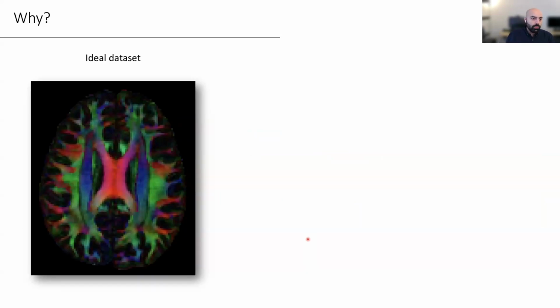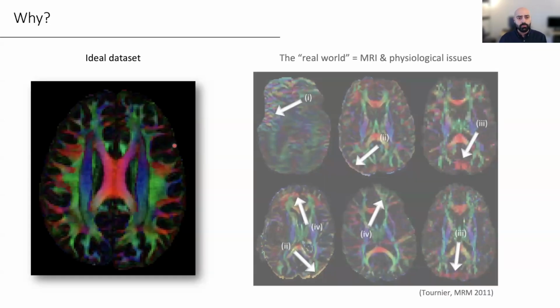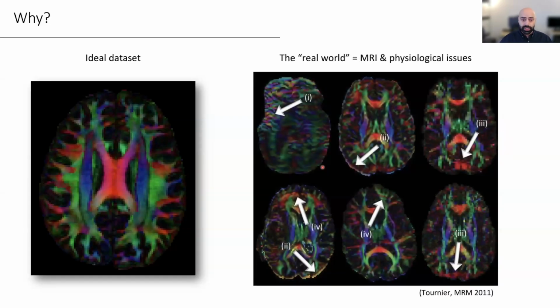So an ideal data set should give us nice output maps, nice tractography. And if we examine the output maps themselves, we should see smooth transition, hopefully within structures, sharp boundaries between structures. We shouldn't see any sudden fluctuations that aren't explained in the intensity in the image or where we don't expect them. But bad data could be pretty bad.